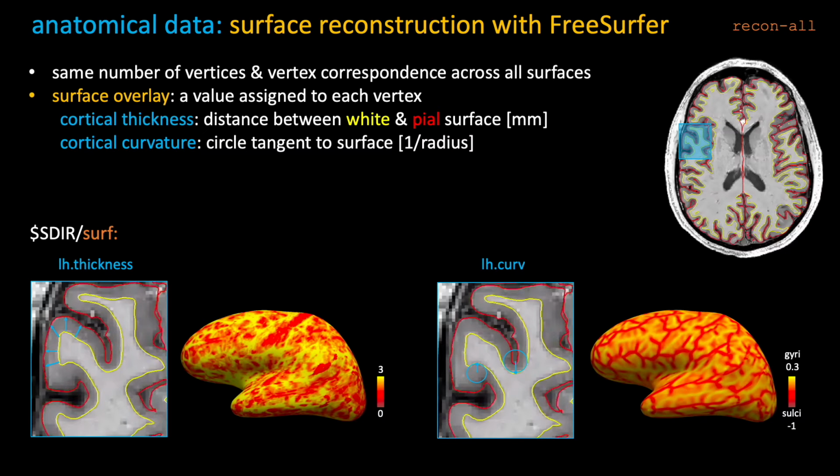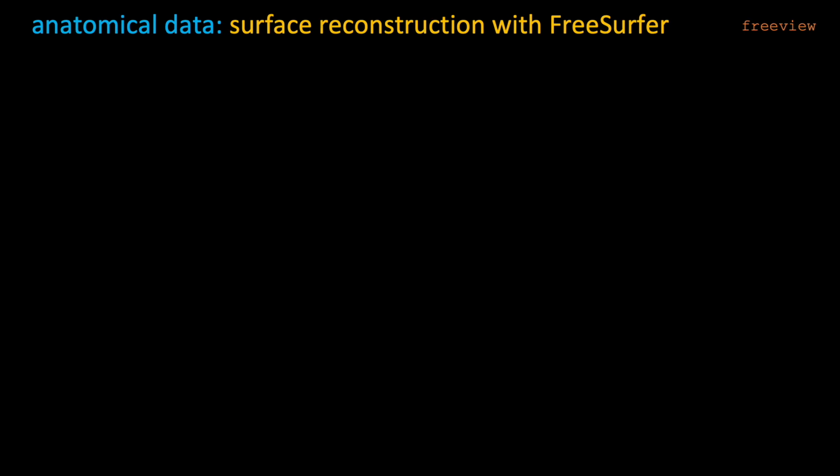All right, so now I wanted to quickly talk about FreeView. FreeView is the viewer that is part of FreeSurfer package, which can help you view volumes, surfaces, and overlays, and a bunch of different things on top of that.